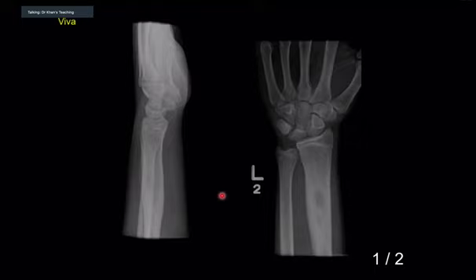Well done. Now, if you see this case, this is a classical exam case. First take-home point: when you see a lesion like this in the exam, never use the words benign or malignant in your description, use the word aggressive lesion. Aggressive lesions are usually of two types.